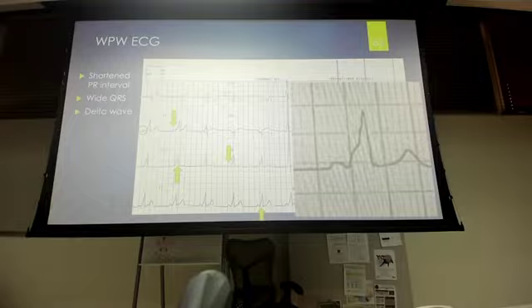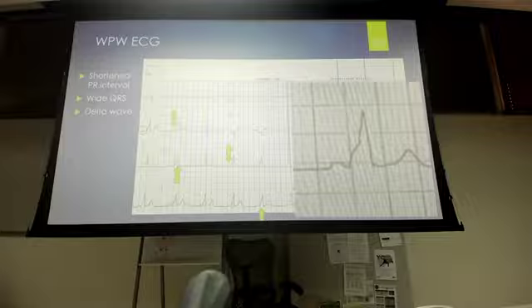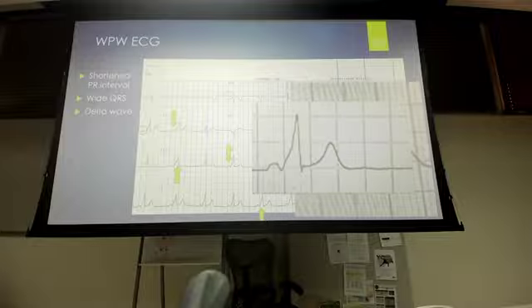So look close. On the exam, I will allow you to bring things closer to your eyeball. Some of y'all got little tiny screens. It's okay to zoom in. It's not okay to go to another tab. It's okay to zoom in to be able to see this. All right. So this again is a picture of another lead of that delta wave.